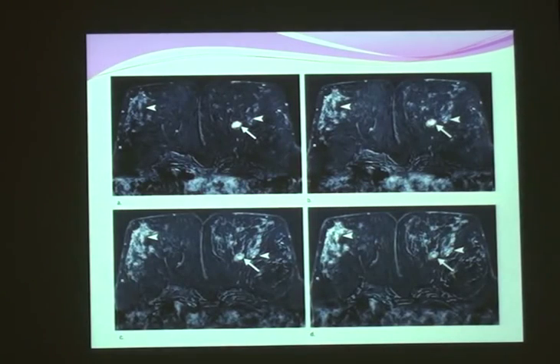This is a very good example for many things I said. We can see here two enhancing structures. We have this diffuse, non-mass-like enhancing area, and we have this. This is about 60 or 90 seconds after injection and up to 4 minutes. We will have a very good notice here: look at this lesion, as we go later in time, it increases in enhancement, while this other one starts to fade away.